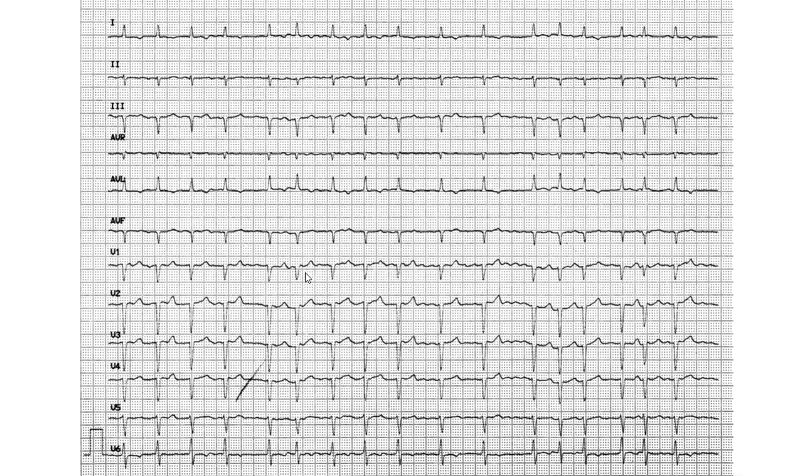Again, we're not sure when we see over here. It's quite debatable. But here, for example, this is QRS, T. Okay, this is a P wave. This is a question mark. Another P wave? Nope, this is a T wave. Then another P wave? QRS, T, P, P, P. No, there is only going to be one P wave. So this is definitely non-sinus, and this is definitely going to be fibrillation.